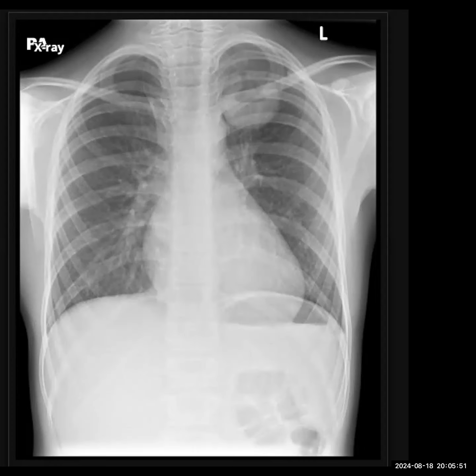Okay, so I'm presented with a frontal chest radiograph of a skeletally mature patient. I can see in the left apex there is a well-defined opacity. The inferior border of the opacity seems well-defined. However, I don't appreciate the superior border entirely. The left apex appears mildly hazy as compared to the right side. I'm looking at the underlying ribs and clavicle. There seems to be no obvious evidence of erosion.